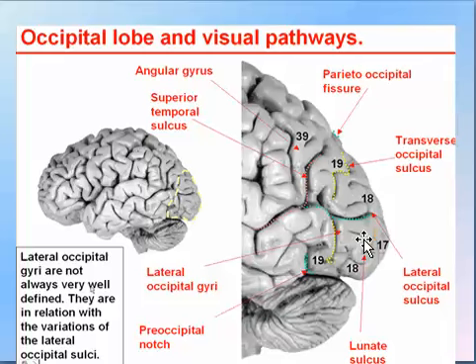So we have two main facts. One is the sulcus separating the parietal from the occipital, called the parieto-occipital fissure, and that it is resting on the cerebellum. And of course, as you see, it is the most posterior part of the brain, and it is no more than one fifth of the whole brain size in longitudinal direction.